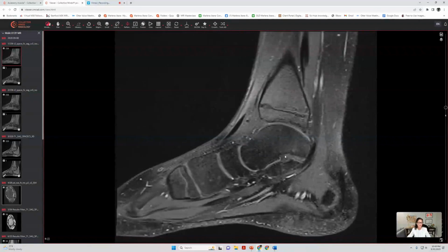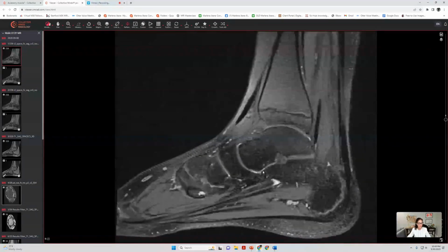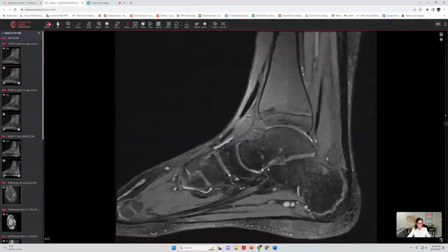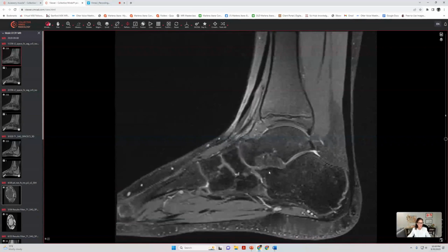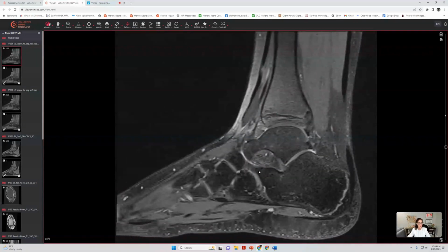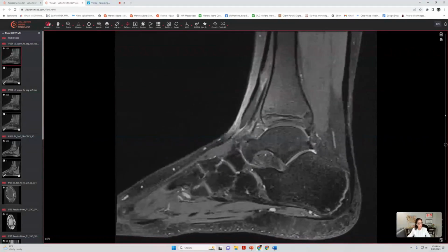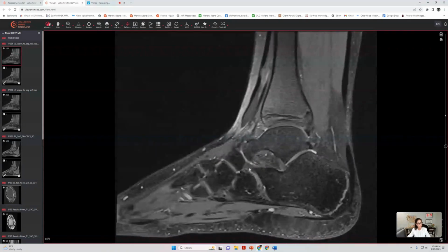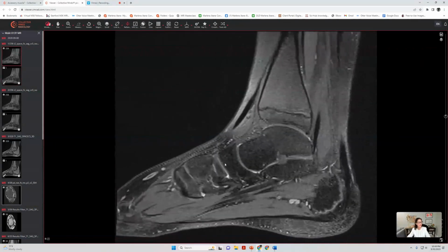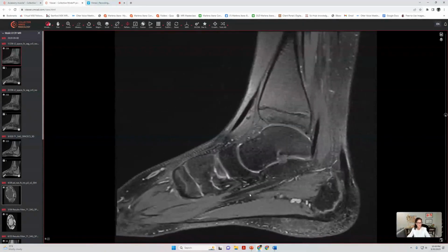in this patient. Moving towards the middle facet of the subtalar joint, sometimes the middle and the anterior are a continuous facet. We can see that here we do not have an osseous coalition in this location. We can furthermore look at the region of the calcaneonavicular articulation to assess whether or not there is a coalition in this location. And we can assess the bony structures of the midfoot, whether or not there are any dorsal subluxations or fractures or any kind of pathology there.